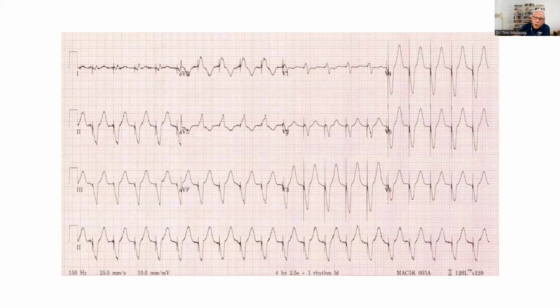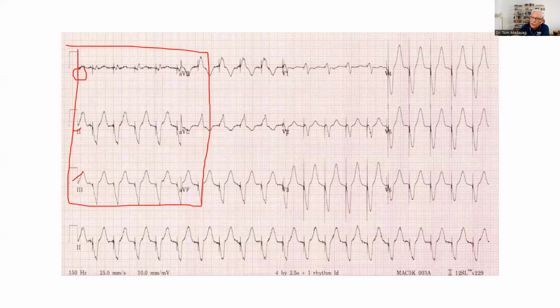And it usually is going to start with lead 1, lead 2, lead 3, AVR, AVL, AVF. And these are all what's called the limb leads. And the reason why they're called limb leads is because the electrodes that are connected to the limbs or to the four extremities are the ones that would give you these views.